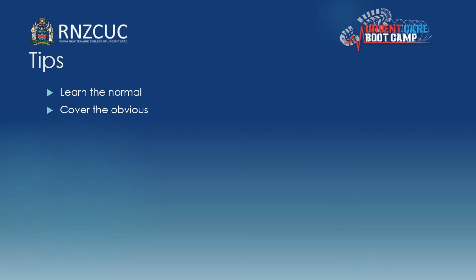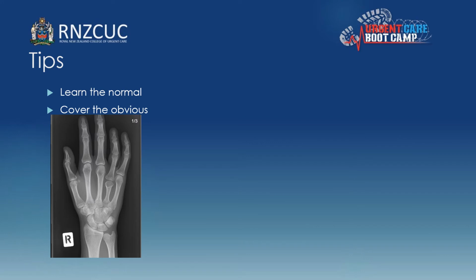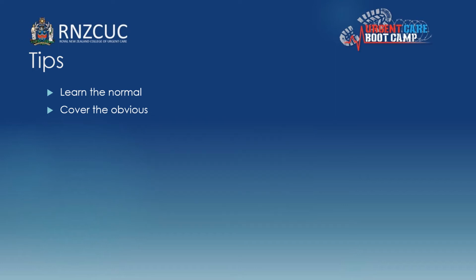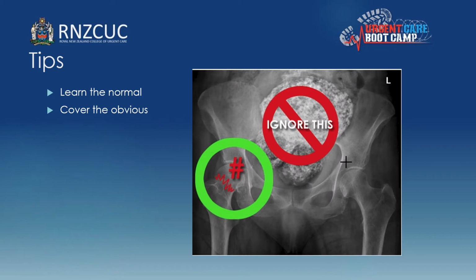So to summarize those things, learn the normal. And the other tip I have is, if something's really obvious and distracting, I basically put my hand in front of it so I can look around without my eyes getting drawn there. So obviously this person's ring finger metacarpal is abnormal, but this is a congenital deformity. But when you see a few hands, it sticks out pretty well. And then moving on to this lady with impressive calcified uterine fibroids, which really does draw your attention to the middle of the pelvis. However, if you cover that up, you will see that she's got a broken neck of femur, so probably a good one not to miss.